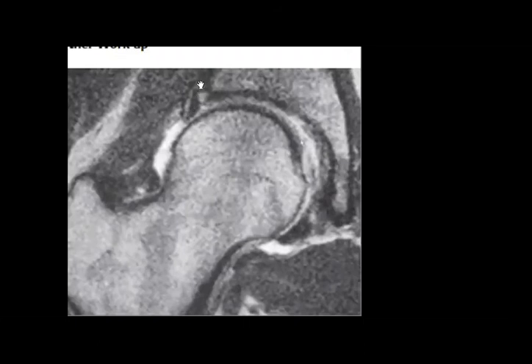You see this high signal in the T2. This should be the labrum, right? So there is high signal here. Yeah.